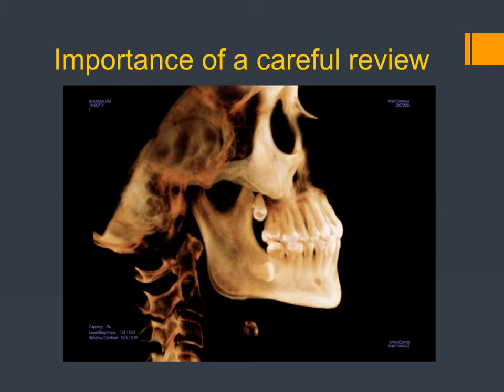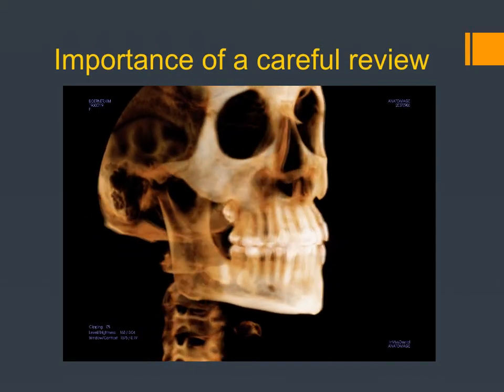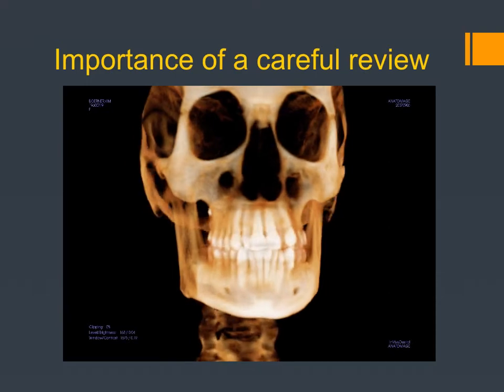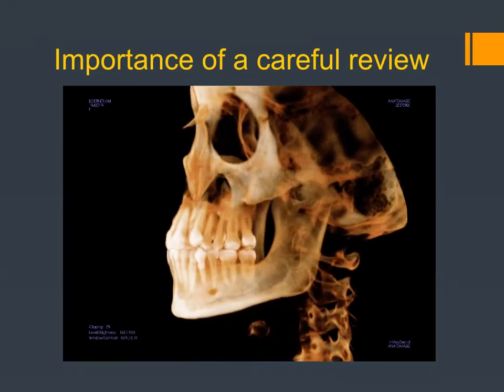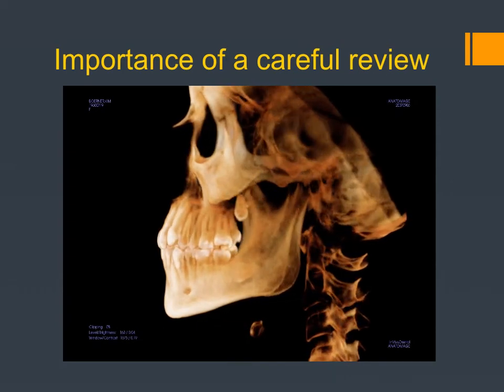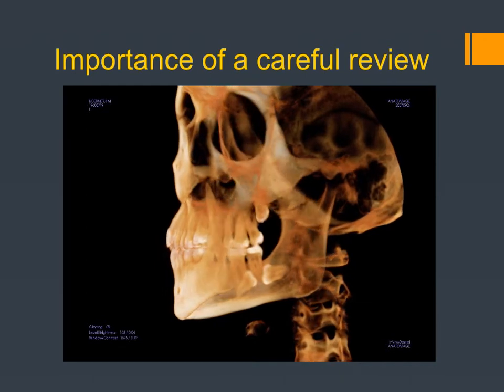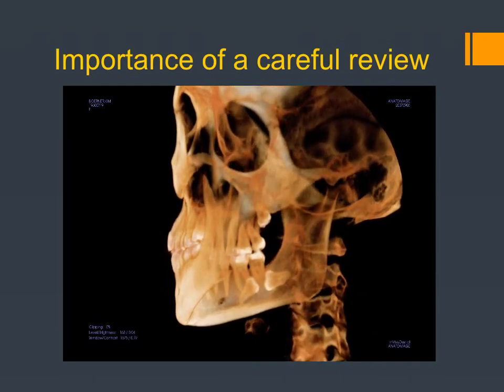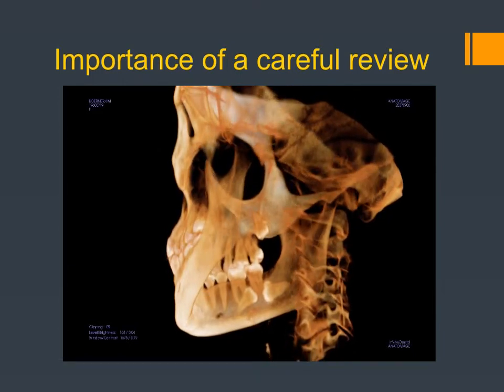Here we have a patient with an impacted canine tooth, and when we start spinning around and looking at the details, we can appreciate there is no wisdom tooth on the other side. But when we get a better look at the lingual of the patient's right side, we see that there's yet another molar down there on the lingual. So I think scrolling through your images is really an important part of the diagnosis.